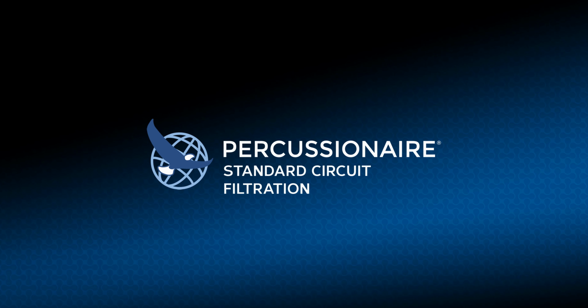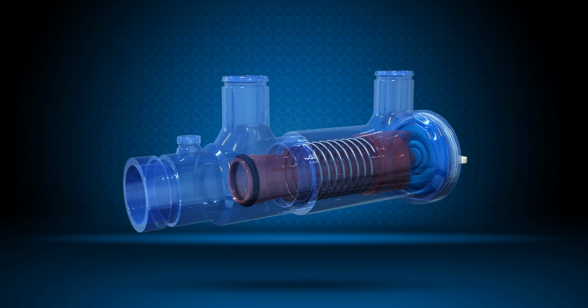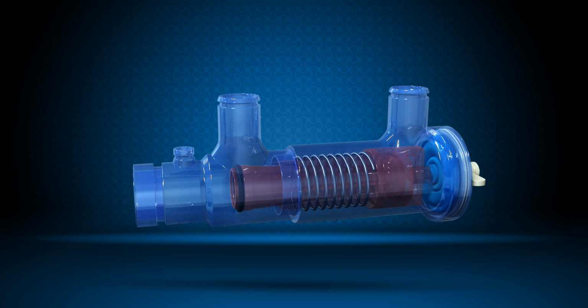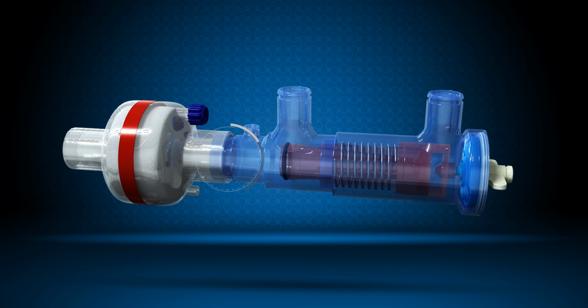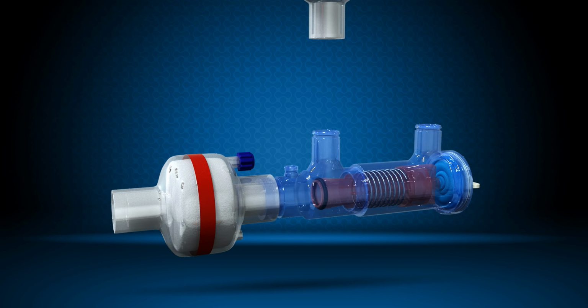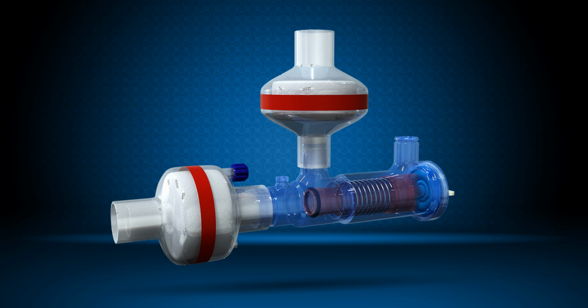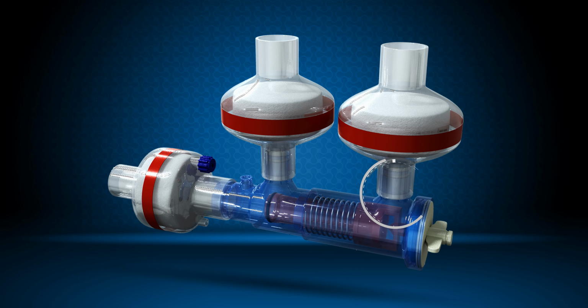Standard circuit filtration. Filtration of the open valving system is at the discretion of the user. An HMEF filter is recommended at the patient connection as shown to provide humidity to the patient. A virobacterial filter can be used on the exhalation port. A third filter on the entrainment port is an optional addition if desired.